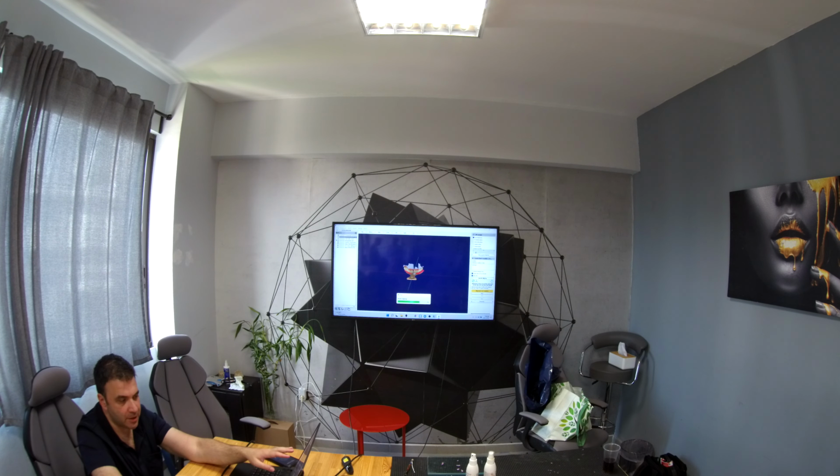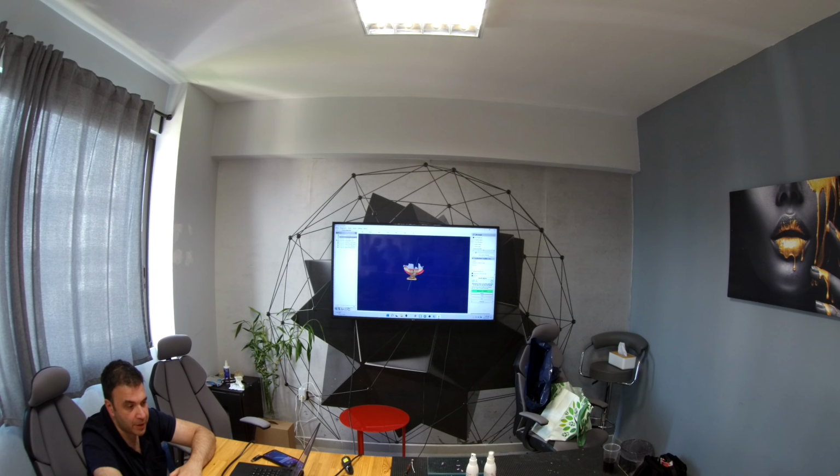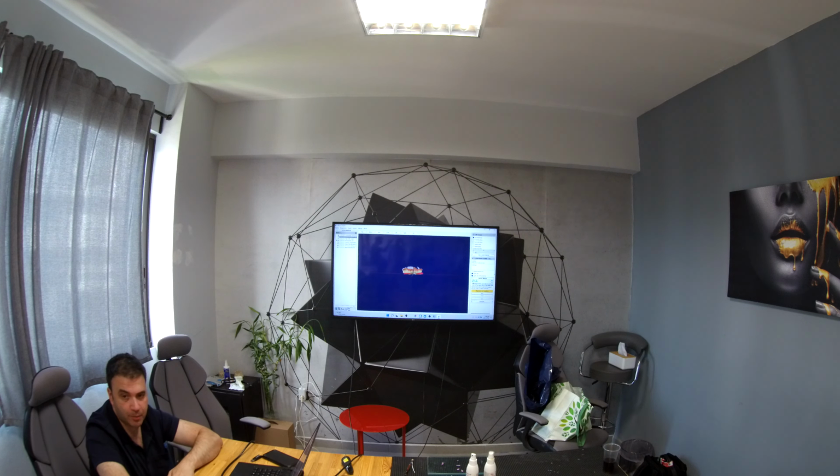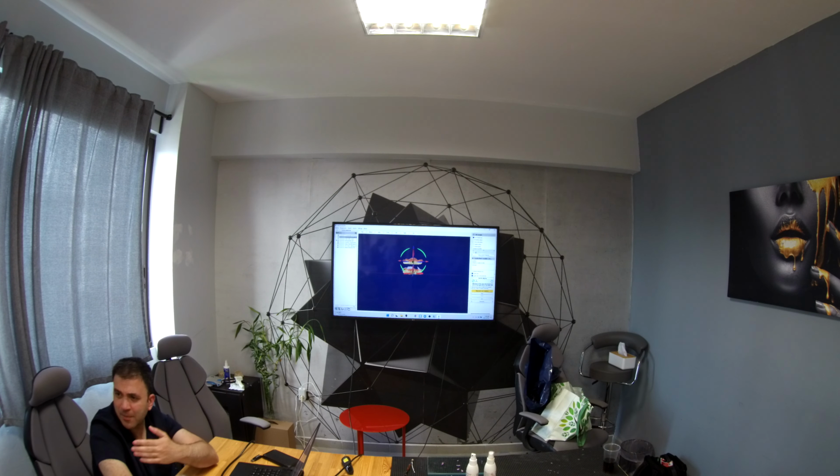And artificial intelligence aligns the scan of the fork with the fork in the software that already exists there as a virtual fork. Then I press next, and I will have the model from the upper scanning, the initial model that we scanned, and I have to realign it with the model on the fork. Just let's pretend I didn't do it before. Once again, I press here, and I have the system correct it. It's almost the same as in Hexacut, yes? So it's pretty much the same. So technicians easily understand it. I don't have to be very precise because artificial intelligence works for me.